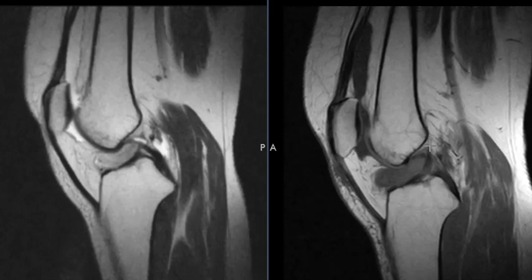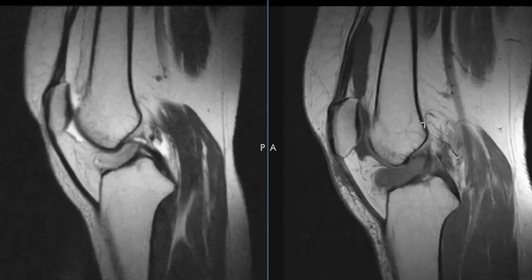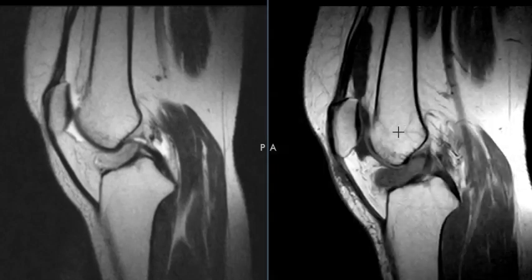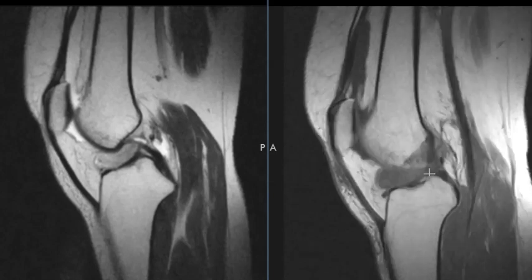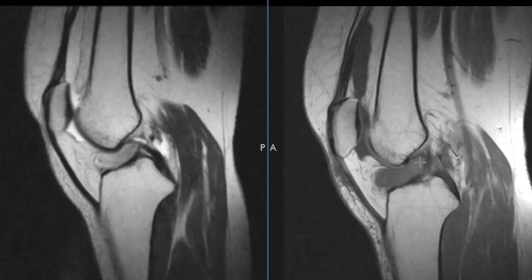This is called a T1 weighted image. On T1, fat is bright and fluid is dark. This is fluid in the knee, and synovium is more gray or intermediate. So this is a nice classic example of intermediate signal here, bright signal on the T2 weighted image here, and this goes along with a synovial pseudomass or benign nodular synovitis.